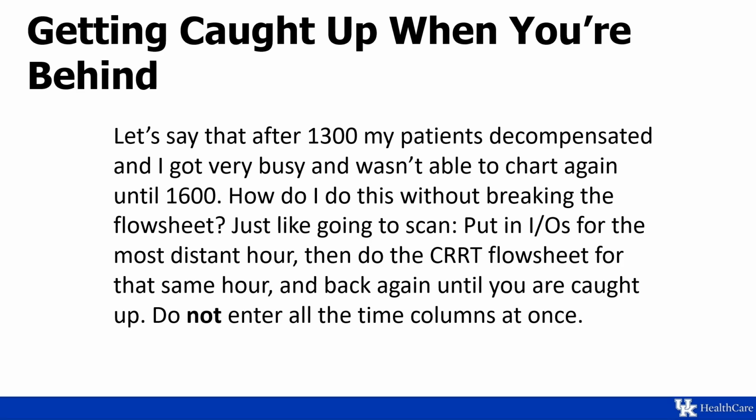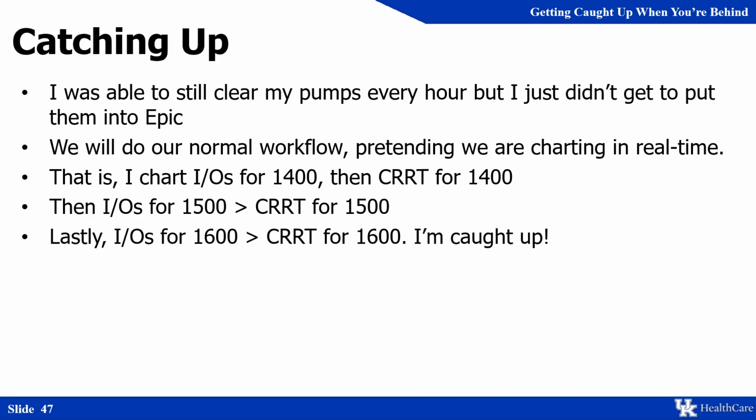Back on track. Do not enter all the time columns at once, because then the CRRT flow sheet will only calculate based on the most recently documented time column, which is 4, and it's going to undo all of your work from 1 to 3 from a documentation standpoint.